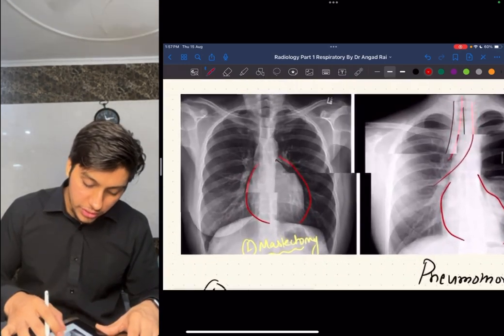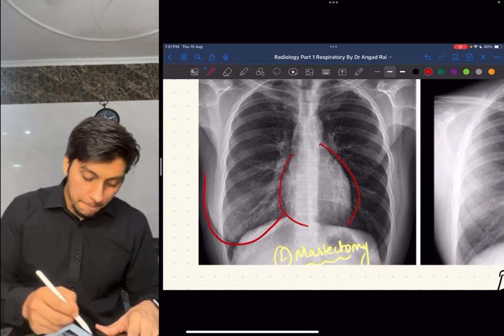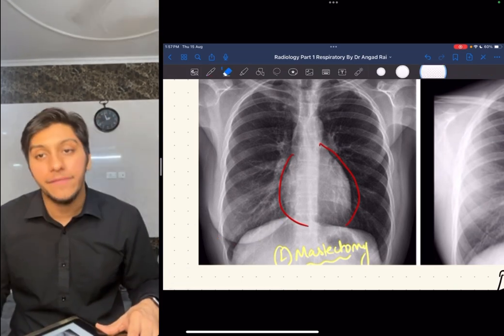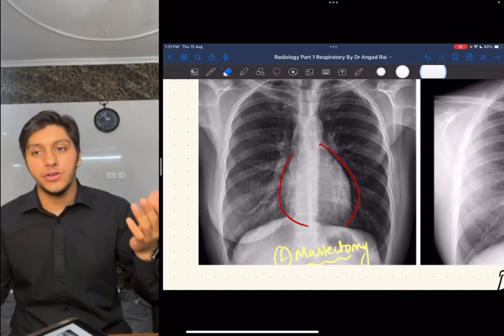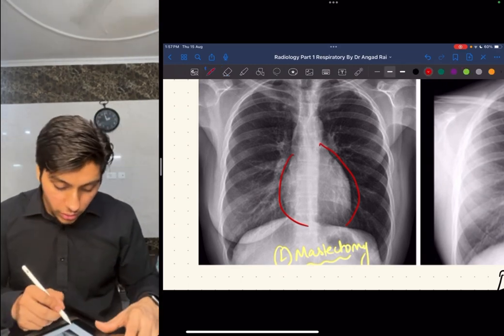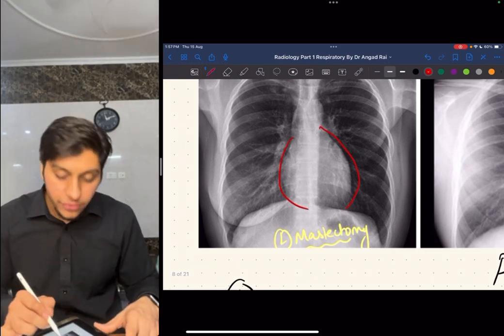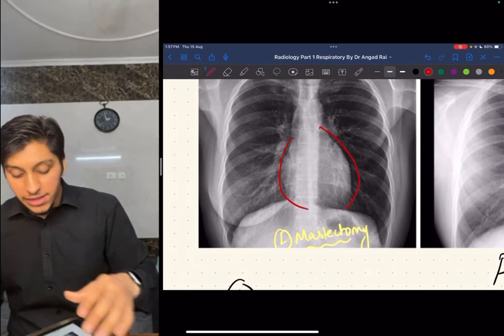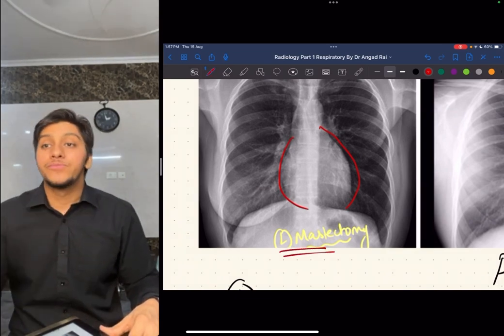Now, for example, I'll show you this condition. Over here, you guys can see there is the right breast margin, but there is no breast margin on the left side of the X-ray, because the patient had a history of maybe breast cancer, due to which she had a mastectomy. And over here, even though you can see black, it's in a lesser shade. Why? Because they have the margin of the breast over here, tissue is there, but in this condition there is no breast, and here the patient had a left-sided mastectomy, due to which it is darker in condition.